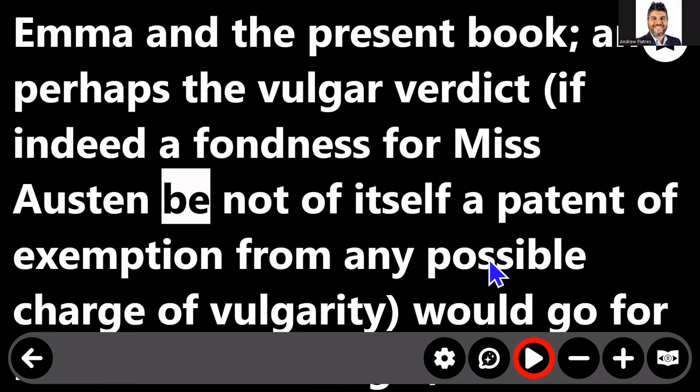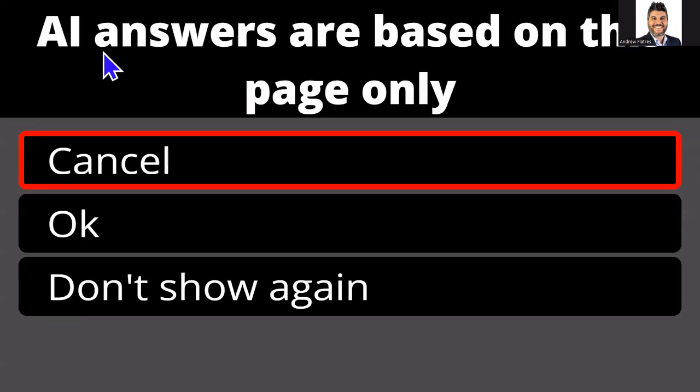So I'll click there. And you'll see that we have, in addition to bookmark and table of contents, the upper right is bookmark, bottom right corner is a table of contents or a navigation tool. In version 1.5 to our reading toolbar at the bottom, we've added the AI assistant here, that call out with 3 stars as well. We'll click there.